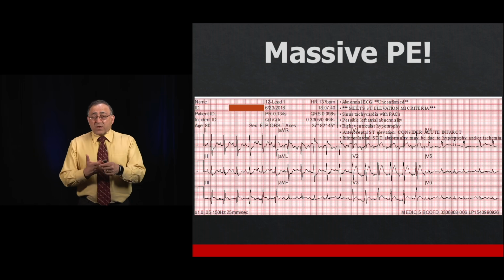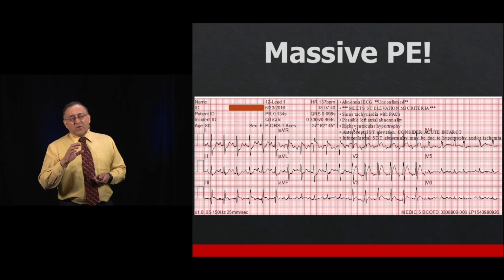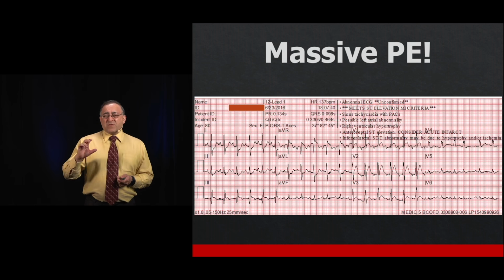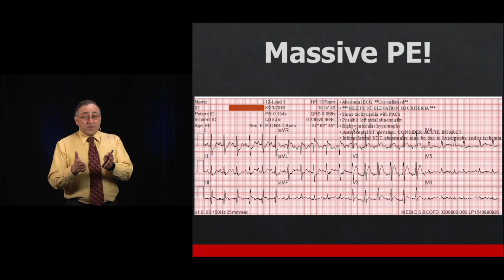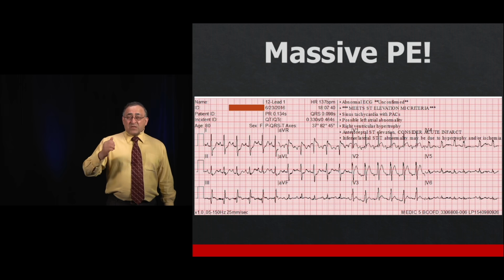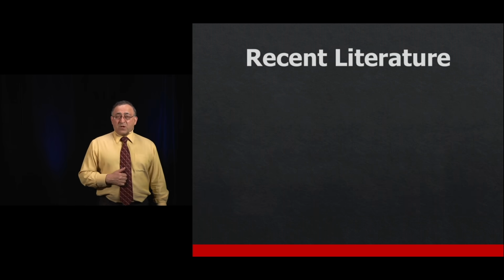leads. V1 and aVR both look at the right side of the heart. V2 and lead 3 also to some extent. So if you're trying to figure out which is the coronary artery that produces ST elevation in the rightward-ish leads, there really isn't one. There's the pulmonary artery, right? If you block off the pulmonary artery, that tends to produce a rightward strain, and that gives you ST elevation in V1 and aVR, sometimes in V2, sometimes in lead 3 also.